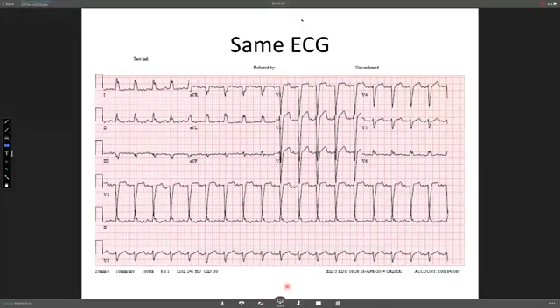So basically, this patient does not require any anticoagulation, and the patient just had a chest infection in the background of COPD, required antibiotics, and the patient settled, and heart rate came down to normal sinus rhythm, and also the patient was investigated further for the left bundle. So this is just a typical example of avoiding interpretation of artifact as a flutter, which is not uncommon.